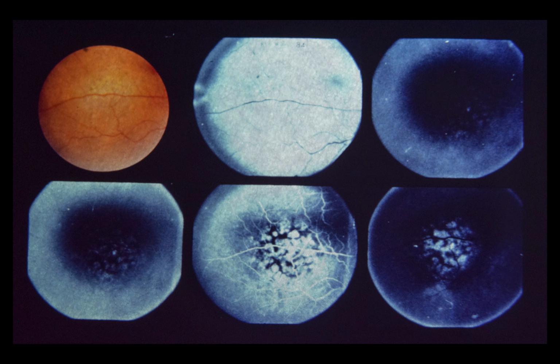Comment: there is no fluorescein angiographic appearance absolutely typical of either choroidal hemangioma or melanoma. Very early filling of a lesion is suggestive of choroidal hemangioma, but this pattern may also occur with choroidal melanoma. The lack of pigmentation does not rule out the possibility of melanoma, since amelanotic melanomas are well described.